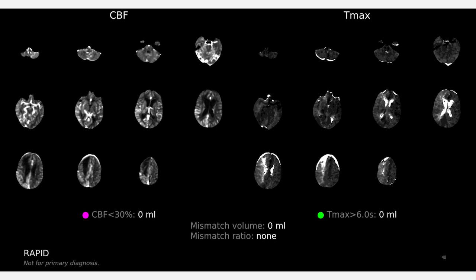If we look directly below that to the occipital lobe, what we can see is very bright tissue, brighter on the right hemisphere than on the left. And what that suggests is that there is increased cerebral blood flow. So increased cerebral blood flow can happen for a few different reasons. It can occur in somebody who's having a seizure. It can occur in somebody with a migraine.